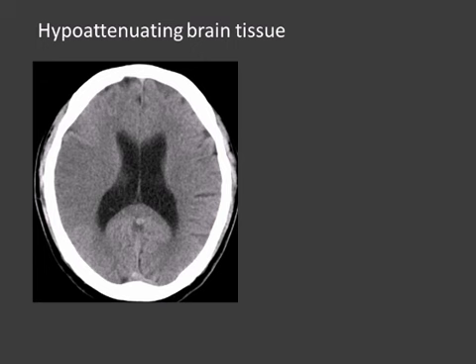Sometimes it's pretty easy. You really see that this is a hypodense area in the brain on the right side, which is ill-defined, and you don't see enough sulci on that side. But it's not always like this.